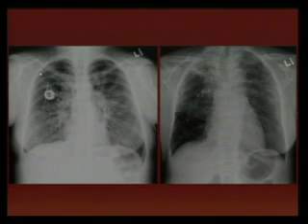Two different types of bronchiectasis: more localized in cases of a chronic infectious process secondary to TB. In this case, you can see the tram lines in the upper portion of the right upper lobe, and you can see here a more diffuse involvement of the lungs, mainly in the perihilar region, in this patient with cystic fibrosis.